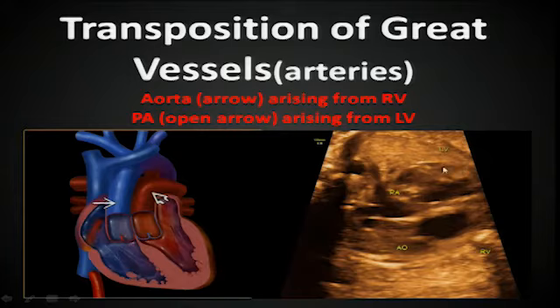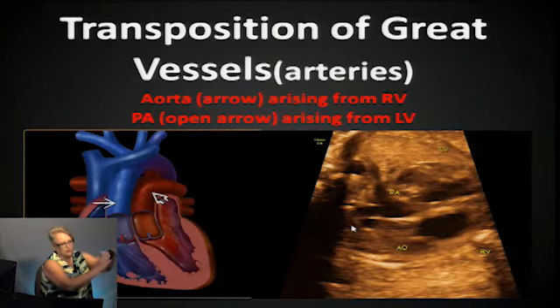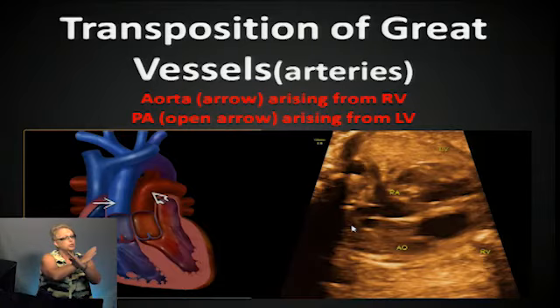So this is like looking at left ventricle, right ventricle. There's that pulmonary artery coming out of the left ventricle, the posterior ventricle, and bifurcating right away. And this is the ascending aorta coming out of the right ventricle. So you have parallel vessels as they're exiting the heart. Vessels can be parallel, it's just where is it supposed to be? When they're coming out of the heart, right at the interventricular septum, they should be crossing each other. When you go to the 3-vessel view, it's okay for them to be parallel. But at the center of the heart, those great arteries should be crossing each other. They should not be running parallel.